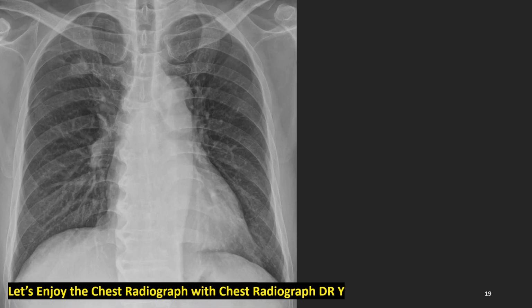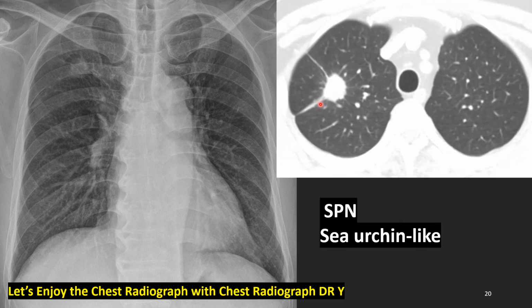The nodules of this section are going bigger and denser, going more aggressive, with more tumor volume. This nodule is in the right upper lobe, definitely dense, bigger, and more aggressive looking with these many spiculations, corona radiata spiculations, invasiveness, looking just like a sea urchin. Have you ever seen a sea urchin? With many spines and needles. That means a very aggressive tumor.